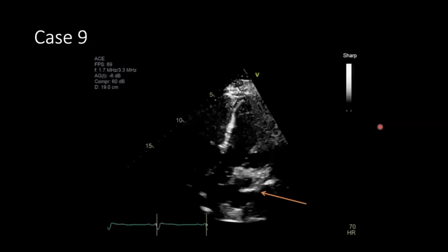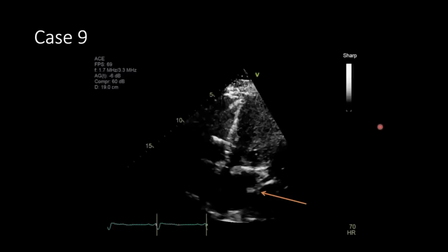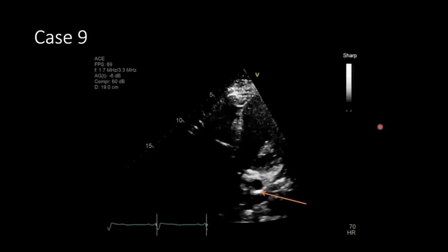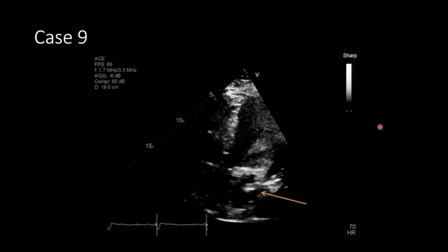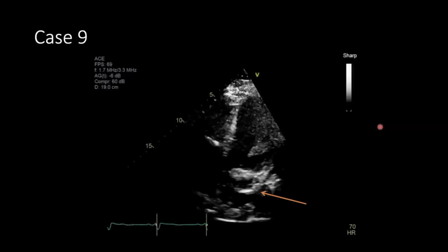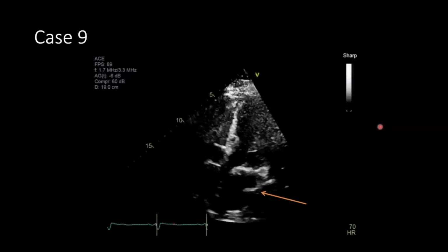I think the ones that survived were metal. The ball was metal because, for a while, they actually made the ball out of some sort of plastic, Silastic, which kind of deteriorated and fell apart, whereas the metal ones lasted forever. So you get the reverberation off the front and the back edge of the metal ball. Yeah, right. So you get that ring down into the LA.